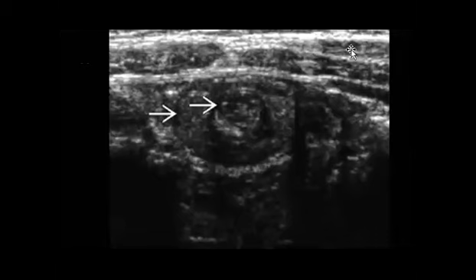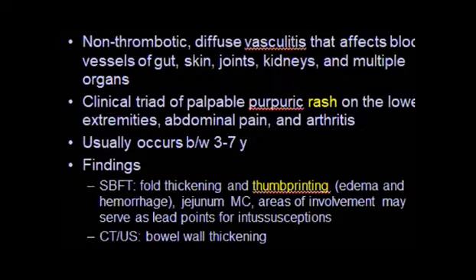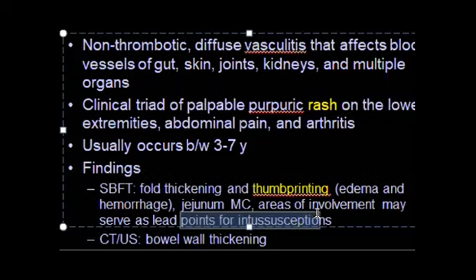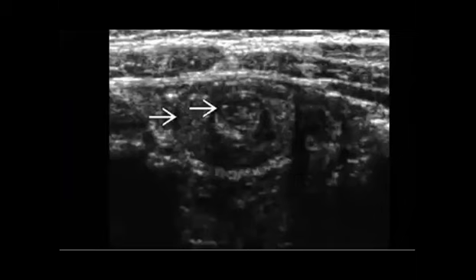This one is an easy one. I already showed you the sign, which is called, in intussusception. You can already diagnose it in ultrasound, perfect, as you see here. And this intussusception can be present again with Henoch-Schönlein purpura. So it can be with the intussusception as well, from the thickening. So it can be a lead point for intussusception, as here. Okay.